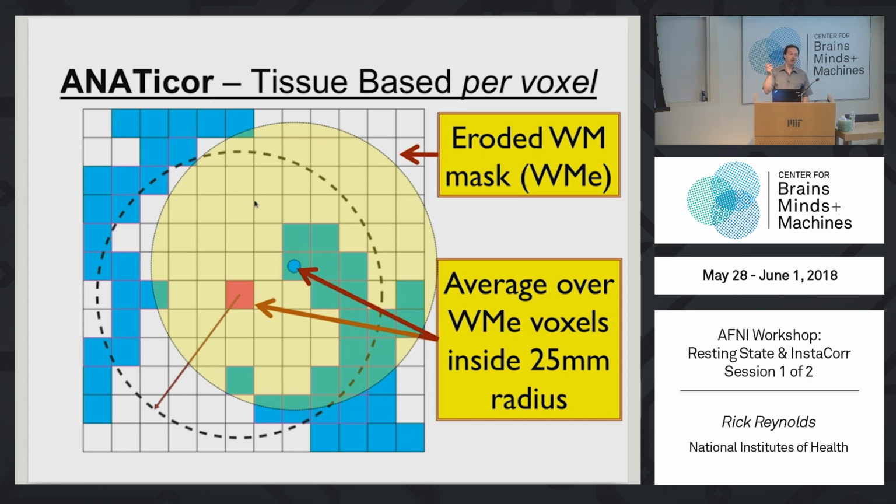But basically, you're removing the average white matter signal that is close to each voxel. So that's computationally a little intensive. At one voxel, you drop a sphere, you get a time series average, and then you have a regressor of no interest at each voxel. So it's a 4-dimensional data set with 1 degree of freedom that you want to project out. I sped this up a little a few years ago.